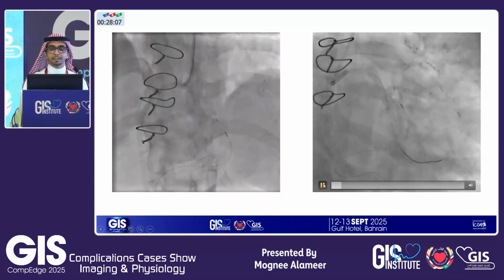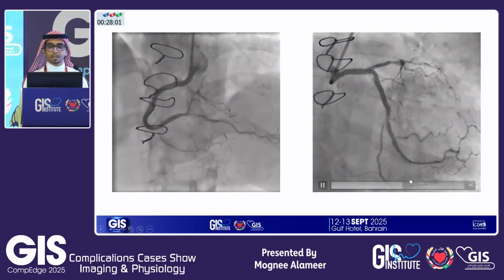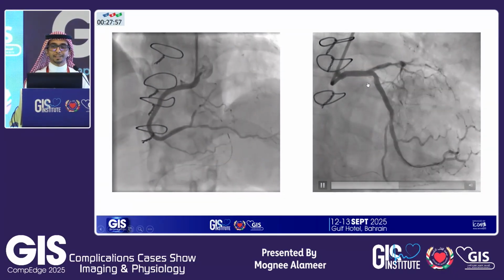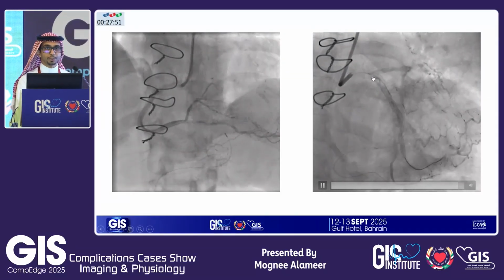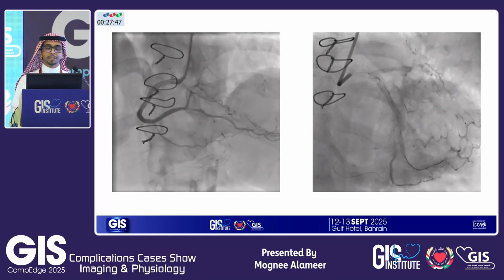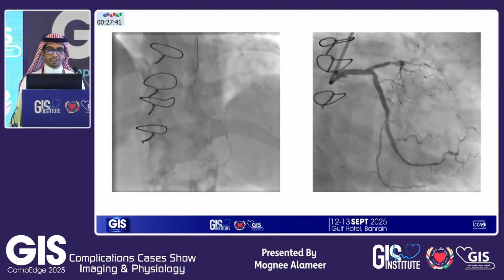And this is the left system. He actually started the PCI from the ostial circ down to this OM, and we can see that there is still some stent under expansion due to the calcified nodule. And in his note, he mentioned that I did my best with post dilation, but this is the best, and it was acceptable. So he ended at this stage.